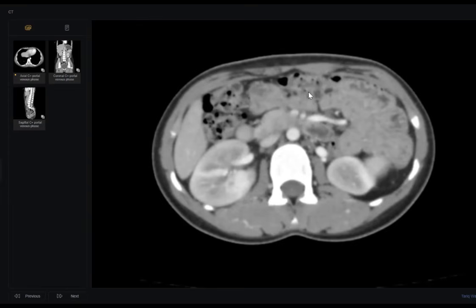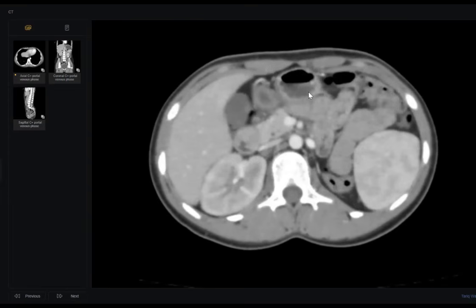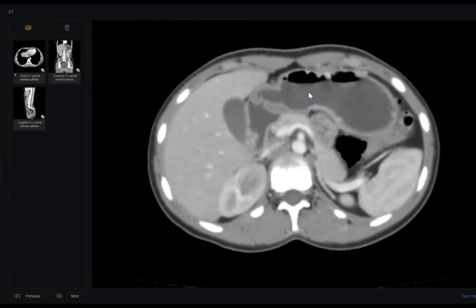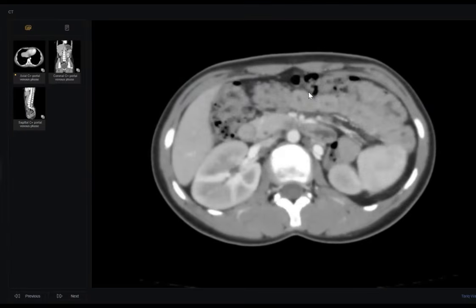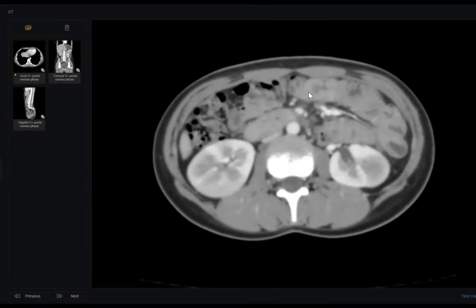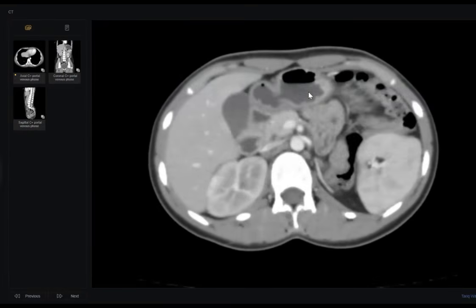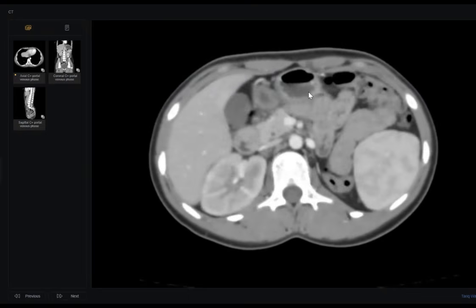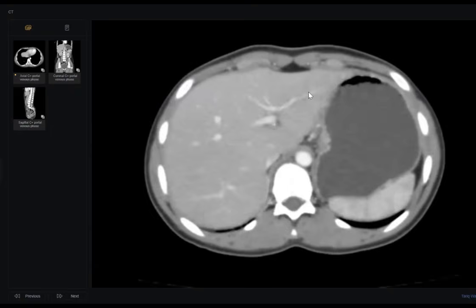The examiner told you this is more than enough. Sir, I will check its continuity, whether it is continuing with the duodenum or not. Sir, I think it is the duodenal part, so it is annular pancreas. I will check the peripancreatic region for any signs of pancreatitis. I will take the measurements of the pancreatic head, body, and tail. The tail, I think, appears edematous.